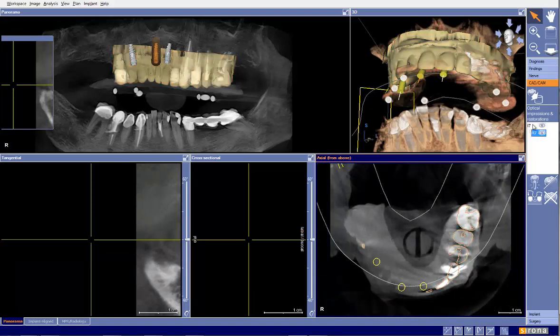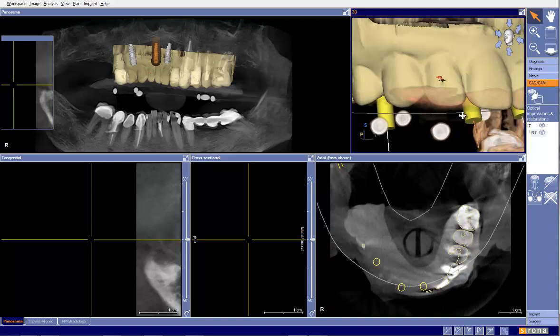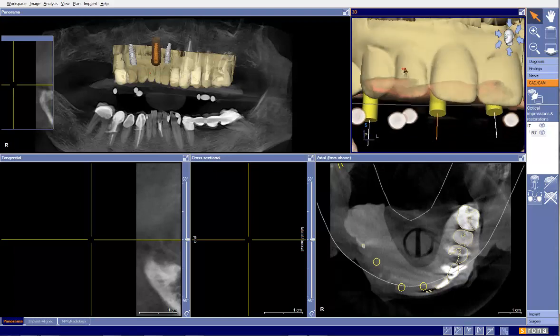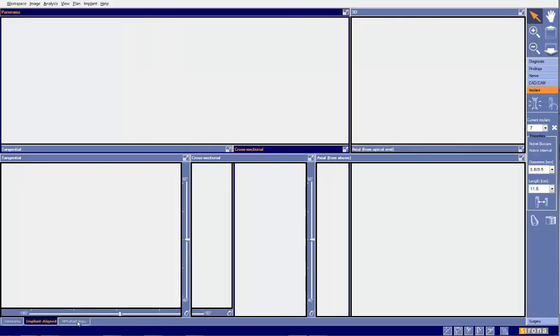And also I want to go ahead and point out that a fake restoration, one of the necessities to be able to integrate data, was drawn here on tooth number 7. Basically a non-tooth was drawn there just to be able to get the data integrated. So that's why that's disappeared. So now we can move forward to our planning, and let's go for this.